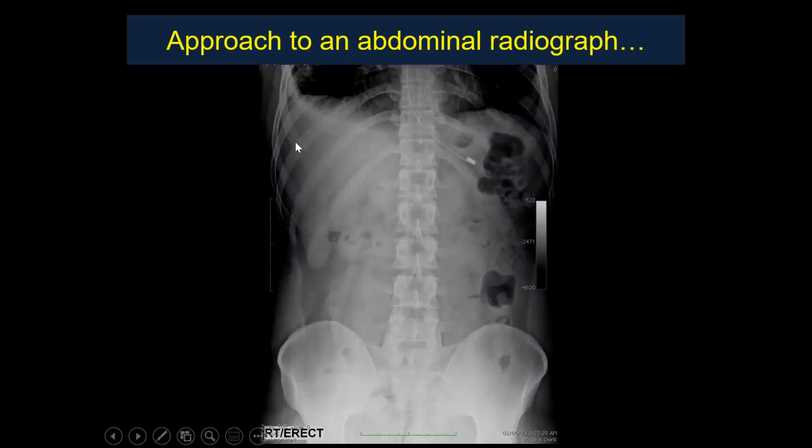So the most important basic investigation is an abdominal radiograph. So it is important for the nephrologist to at least make a basic interpretation of the abdominal radiograph. As we can see, the radiograph covers the abdominal part right from the level of diaphragm up to the pelvic cavity, and this is the region of the kidney. So we can see the renal shadow on both sides, which should be at least 3 vertebral bodies in thickness. So the normal length, long axis dimension of the kidney covers a span of 3.5 vertebral bodies, as we can see here. So this is how we can judge that kidney is normal in dimensions, even on the plain radiograph.